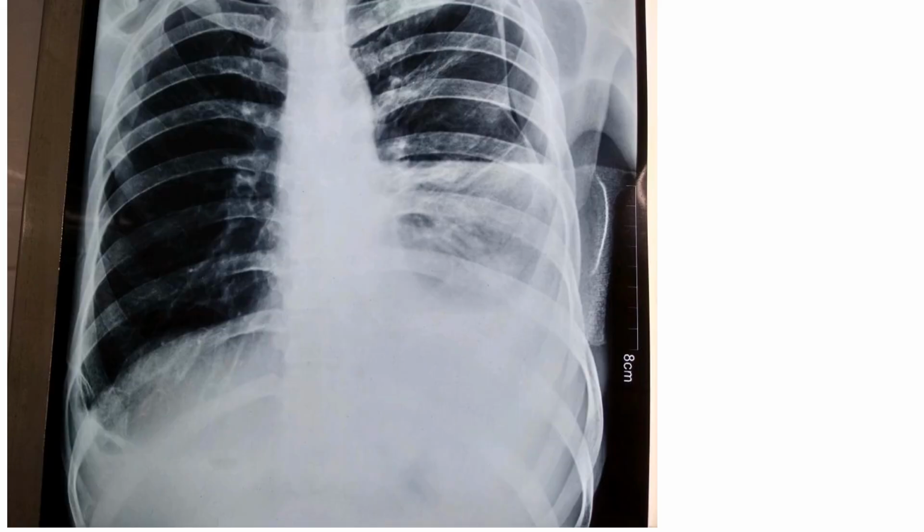So this is a next example. You can see a straight line here, right? Above it's dark. This lung is partially collapsed. The pleura is somewhere here. The pleural line is somewhere here. This is the pleural space, and below we have fluid, right? So perfect straight line.